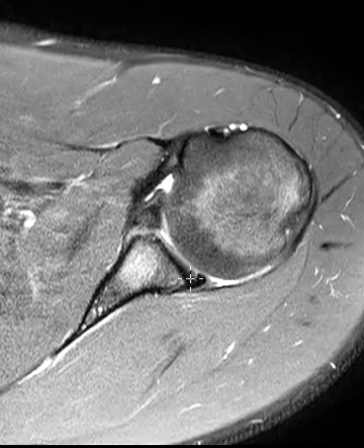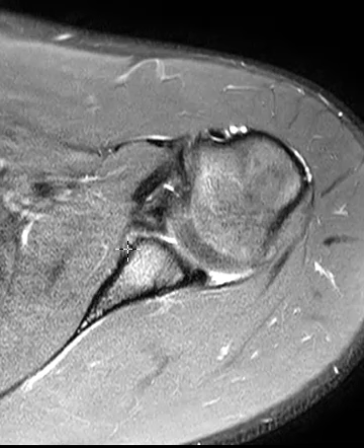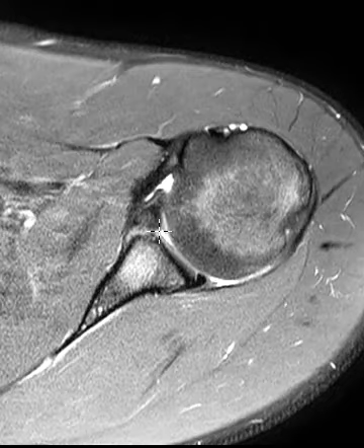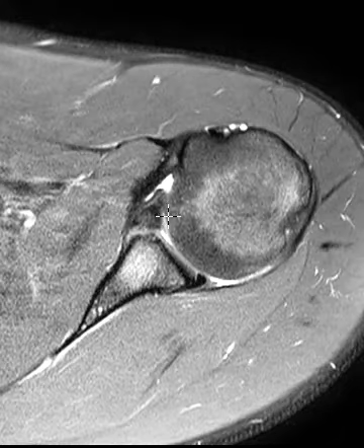You can see the back rim is nice and sharp. And here this is blunted, and this is the bone fragment that's free and elevated. This is the anterior joint capsule and periosteum. This is periosteal stripping, and the periosteum is still attached to that bone fragment. So this is what we call a fibro-osseous Bankart lesion, and it's related to a shoulder dislocation.